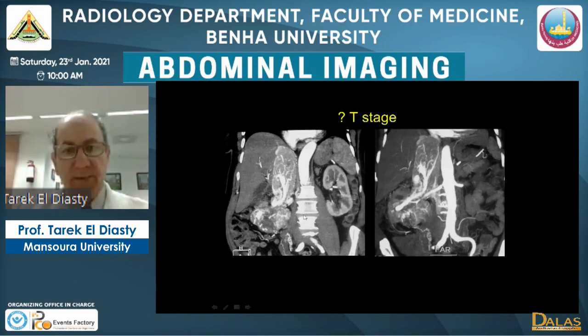Why T3C? Because it is fixed to the wall. So even if it is at any level of the vena cava, if it is fixed to the wall, as evidenced by this vascularity in the vena caval wall, it is T3C.